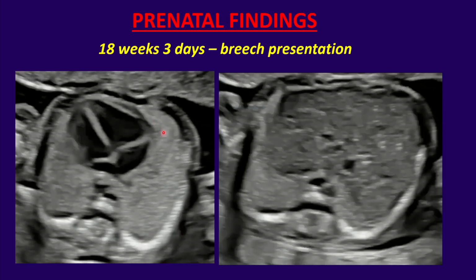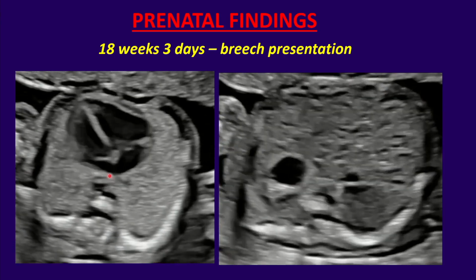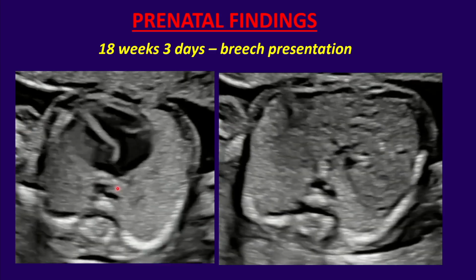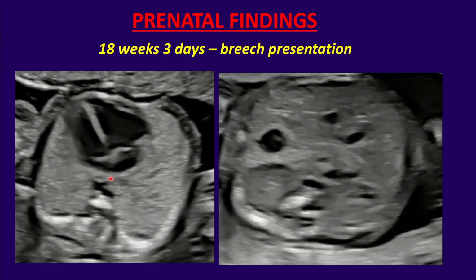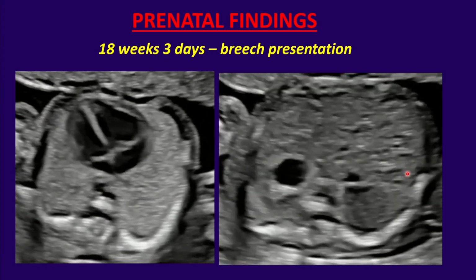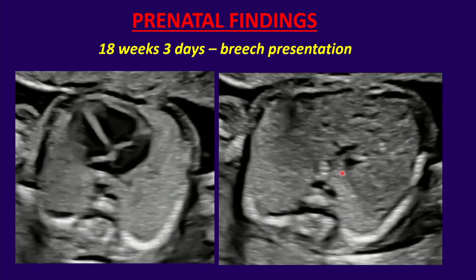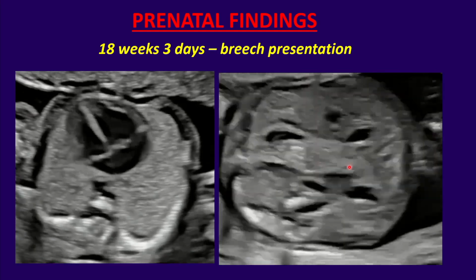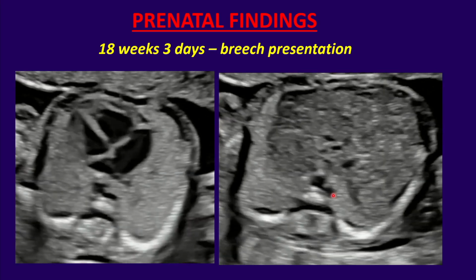But what can we see here? We cannot really see the normal drainage of the pulmonary veins, at least not of all pulmonary veins here. You can speculate, looking at the 2D image, that it might be something here, but you can see the normal portal sinus, and what's really important, we can see a normal image of the IVC on this abdominal circumference. If you can see a normal image of the IVC, then why is the azygos dilated?